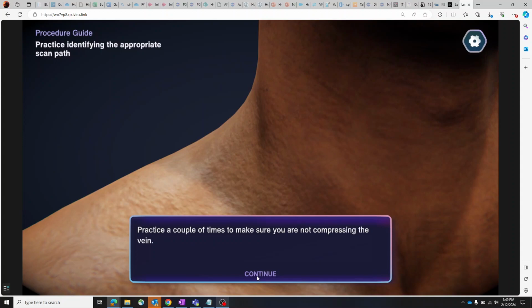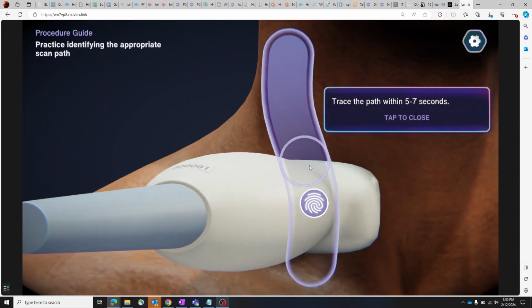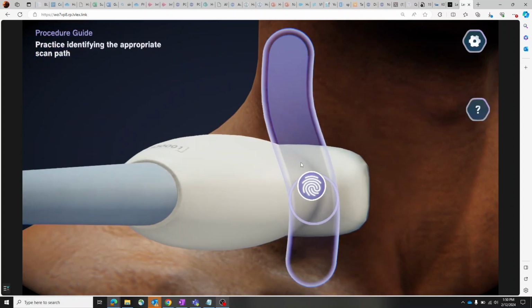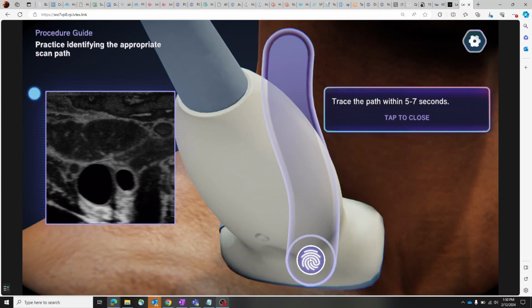So this is meant to be intuitive. You're able to click on the different images and see which one is incorrect and which one is correct. But as you go through that process, you'll be able to understand what it is we're looking for. We've also provided hints if you tap on the question mark icon that can give you a tip on what we're asking you to look at in this image. So here the spectral target is a little off angle and not centered.